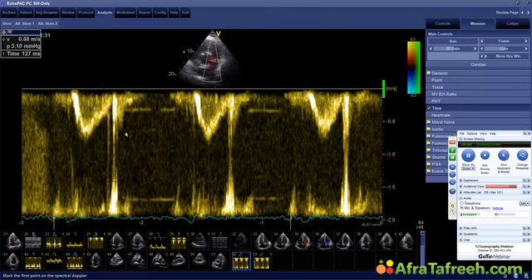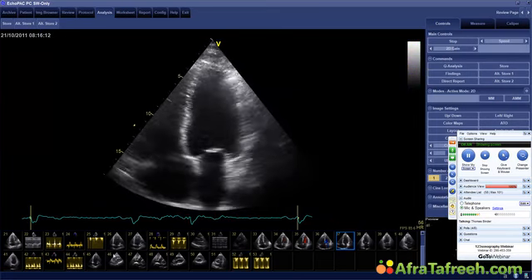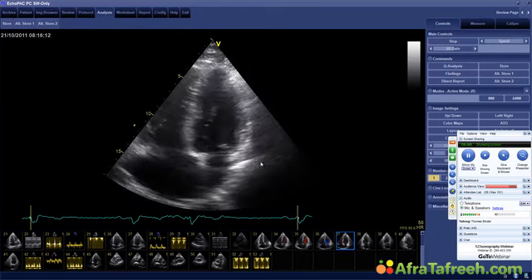This signal also tells me something else. It tells me that despite the fact that the patient has a reduction in right ventricular function, there still is enough flow. So I think even though the ventricular function is reduced, he still has enough flow to not be severely suppressed with respect to his exercise capacity. And finally, the last comment that I would like to make is this patient obviously has a very poor prognosis, because we know that patients with right ventricular infarcts in general have a very poor prognosis. And I would expect this patient sooner or later to get edema of the legs and pleural effusions and maybe even more tricuspid regurgitation and so forth and so on.